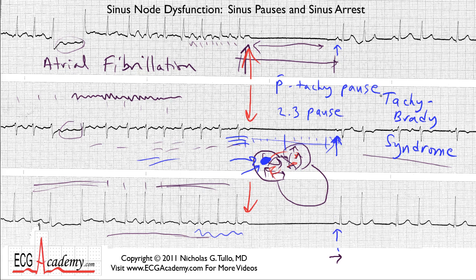Well, of course, in this case, what follows are a series of atrial premature beats, which we'll talk about. Here's a sinus beat and then a premature beat again, and then you're back to a sinus beat. So you've got a lot of atrial ectopy or premature beats going on. This is all stuff that we'll cover in subsequent sections, but I wanted you to know exactly what this is so that when you see it again in the future, you'll begin to recognize it.